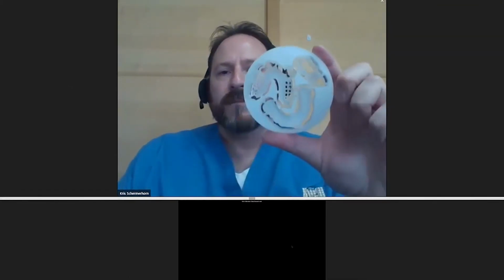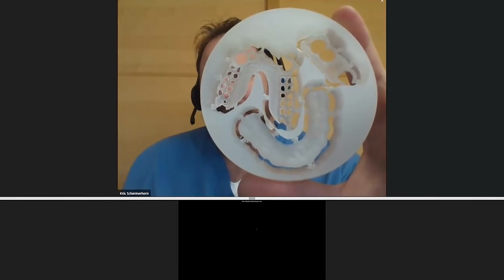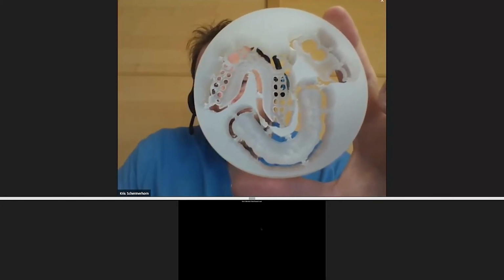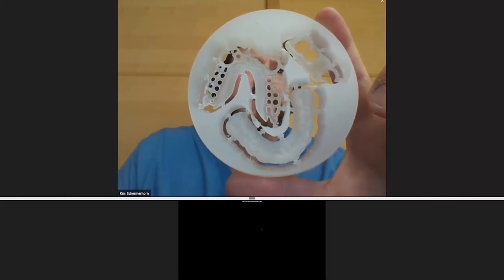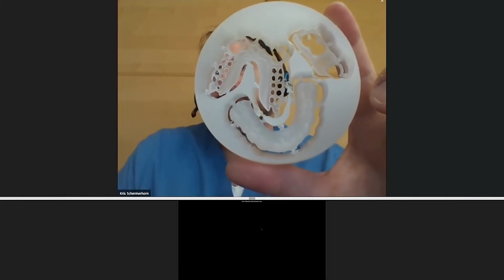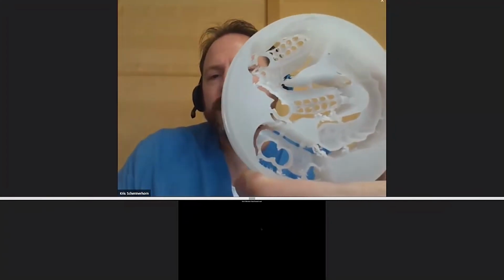One thing I'll show while we're waiting to see if any questions come through is, this is always difficult because I move the opposite way on the camera, but here's a puck that's been milled. A nice little variety of things. So you have a night guard, a bite splint. The times where I would do a bite splint would be whenever you would have a clincher, because it has give to it. It's not going to be super wear resistant like the Zerlux acetal, but it will have a nice clinching. You have a framework there, and you have your unilateral.